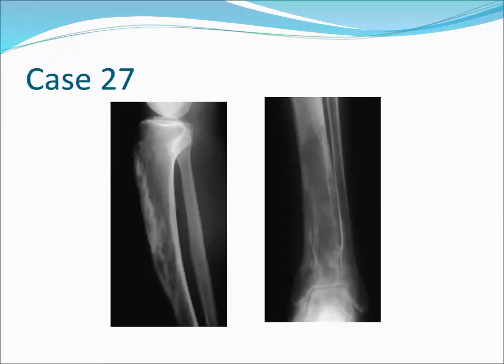Case number 27, Paget's disease. The lytic phase in two different patients. Relatively well-defined V or flame-shaped areas of deossification containing strands of increased bony densities in a slightly expanded shaft are characteristic, A, proximal tibia, B, distal tibia and fibula.